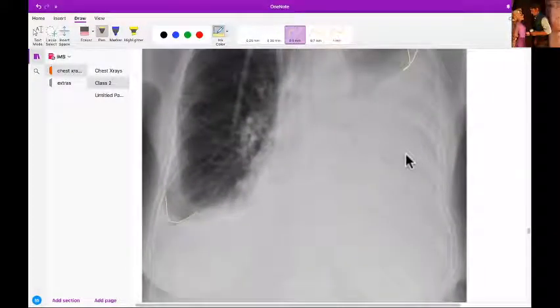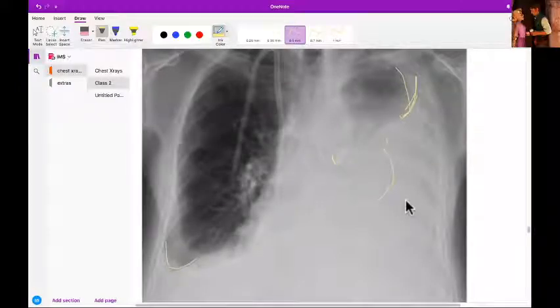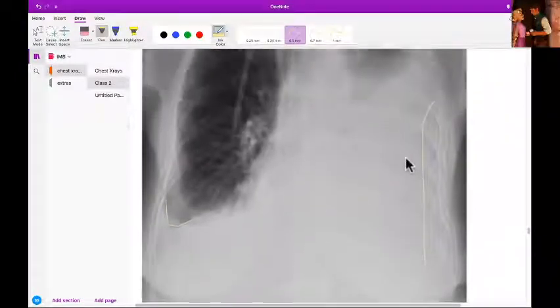So basically, this intrapulmonary thing can be a collection of anything. It can be pus, it can be pneumonia, it can be fluid, it can be blood. Okay. So then you will see this meniscus effusion kind of a thing, and you will see these air bronchograms. You won't know what it is. You'll have to put a chest tube to see. Yeah, it could be empyema, but empyema is present in the pleura, so it'll be mostly limited to one side, like a long thing. This is in the lung.